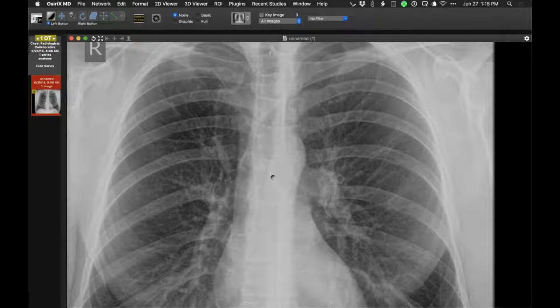Sometimes if you have a lateral and you look in the retrosternal region, you'll see there's quite a bit of lung there. But this is just an anatomic interface where randomly the right upper lobe abuts a portion of the ascending aorta, its right lateral aspect, and is entirely normal anatomy. So just a nice example of that.